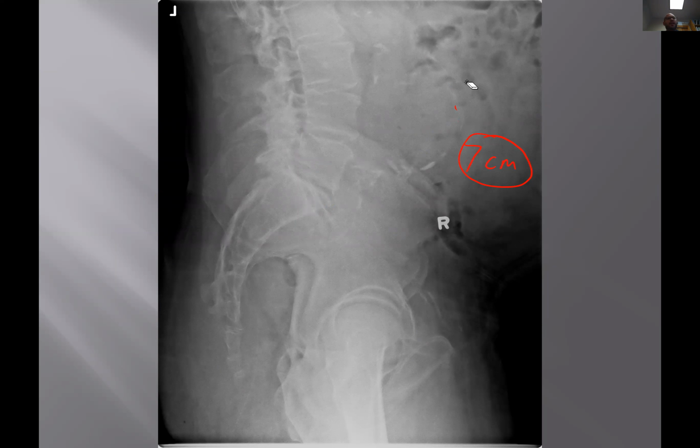What is the diameter above which we have an aneurysm? You guys remember, or I don't know even what Dr. Albers, if you were at Northwestern, Dr. Mick. 3.8. 3.5. Okay, so yeah, good. So that was really specific. Those numbers are really good. I just stick with greater than 4 centimeters.